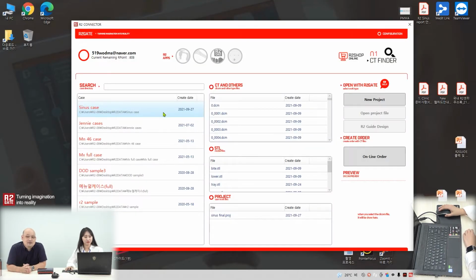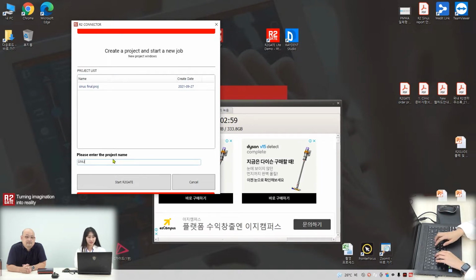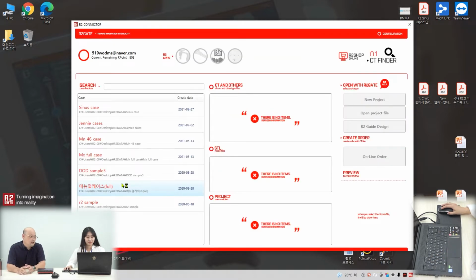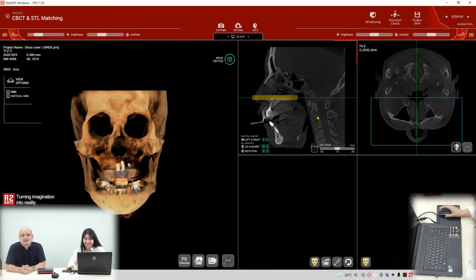Okay, which case? The patient name is sinus case. Okay, what's next? New project, prepare data. Click the new project and write down the project name. Sinus. And start. You can put any project name, not just sinus. You can put the patient name and date and whatever you want. Somebody asked me whether we should write down just the sinus or the mandible, lower jaw, but it's up to you.